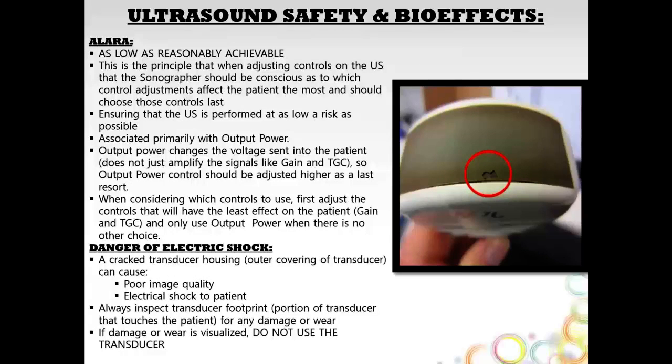ALARA. This is one of the most important things that a sonographer can know. This is our ultrasound safety principle, and it's known as ALARA, which stands for as low as reasonably achievable. And what this means is when a sonographer is adjusting controls, we should always be paying attention to what is our MI, what is our TI. These are listed at the top of an ultrasound monitor. It tells us what they are. And also, we should be looking at what our output power control is.